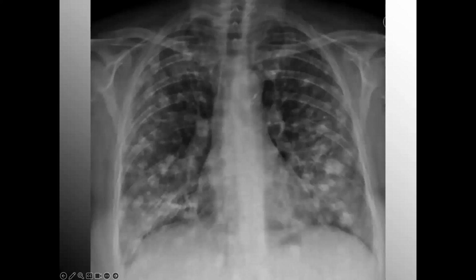Do recall that with chest x-rays, of course, description can help with diagnosis. Think about things, what you're seeing here, such as shadows, opacities, or densities. What's the size of the nodules? Are they on both sides? That could maybe imply there's some dissemination. Are there multiple nodules? Is it widespread? Is it mainly in the middle or lower zones, or is it upper lung? What's the shape? Are the borders irregular? Are they linear? Is there a nodular pattern? Is there a soft tissue density? Are they calcified?